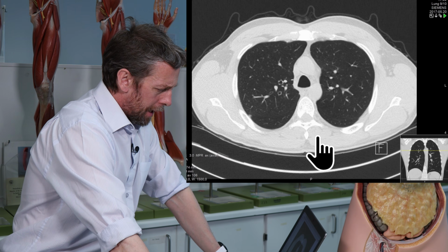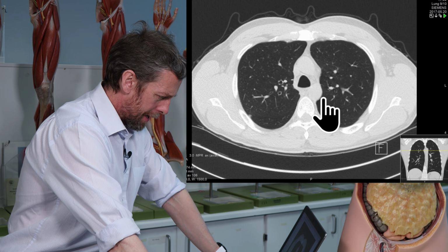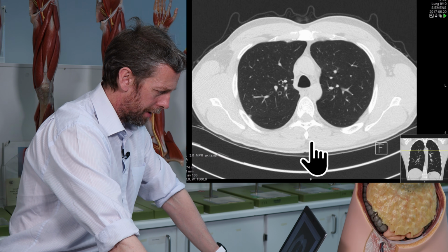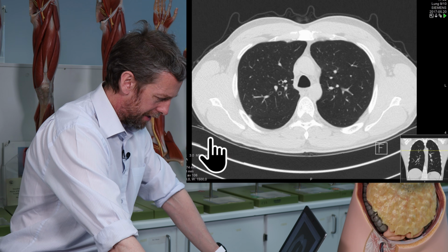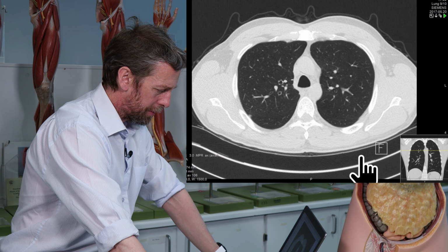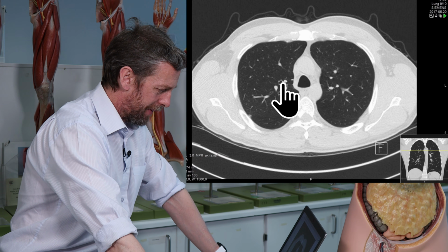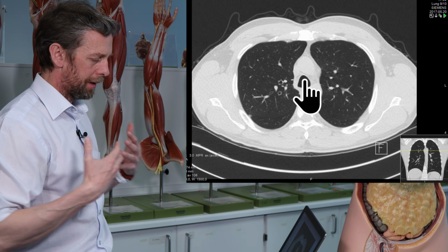Now, there is a standard way of approaching this. Here is the vertebra. So this is posterior and this is anterior. So this is the back of the person. You can actually see the curve of the surface that they're laid upon. So this person is laid down, face up, and their feet are coming out of the screen towards me.